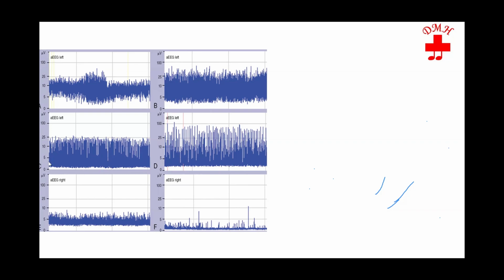Okay, what is happening here now? Look at the lower margin. Lower margin is below 5. Upper margin is below 10 but above 5. And then there is something happening here, which is going up to 25, maybe just crossing 25 also. Similarly, if you compare this graph, like the left graph, the lower margin here is also below 5 and the upper margin is around 5, but definitely more than 5. And then you can see similar lines which are touching and going beyond 25, right?